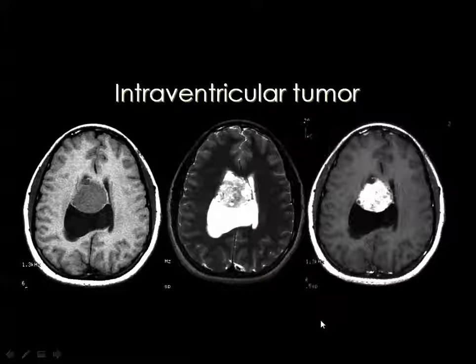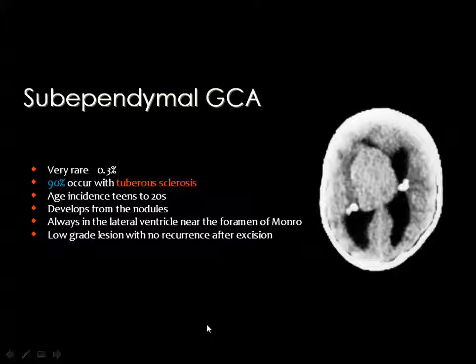And this is a similar case, and you can see a tumor inside the right lateral ventricle. The right lateral ventricle is grossly dilated, no evidence of periventricular edema around the lesion, and the lesion showed a strong, almost homogeneous post-contrast enhancement. Then the diagnosis here is just an intraventricular tumor, which may be an ependymoma or a choroid plexus papilloma.